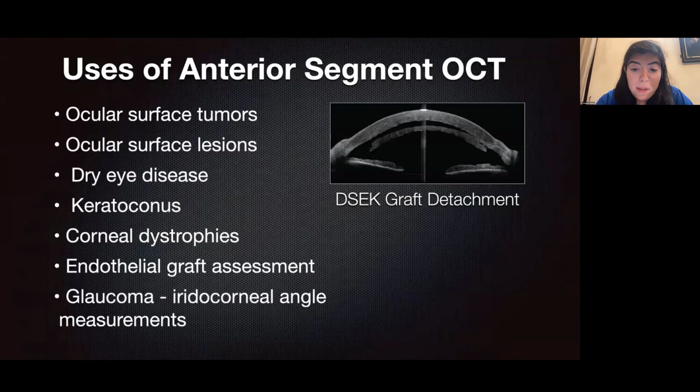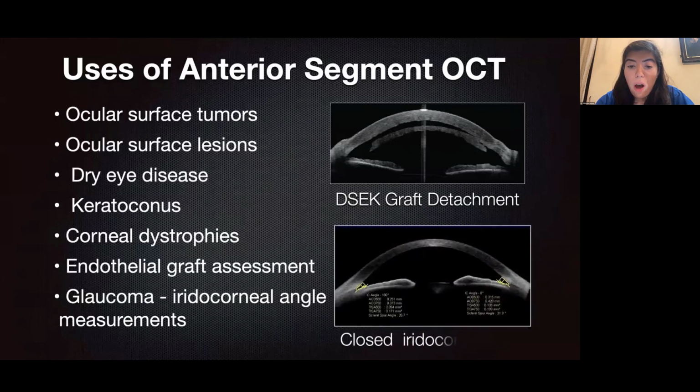Now, anterior segment OCT has also shown great utility in the field of glaucoma, allowing for acquisition of highly reproducible iridocorneal angle measurements as compared with ultrasound biomicroscopy or UBM. And this image on the right visibly exemplifies closed iridocorneal angle.